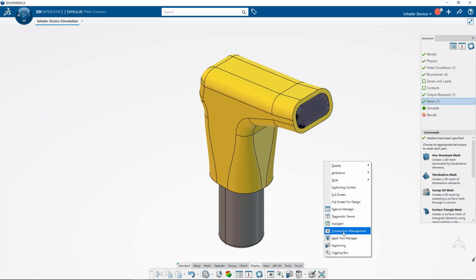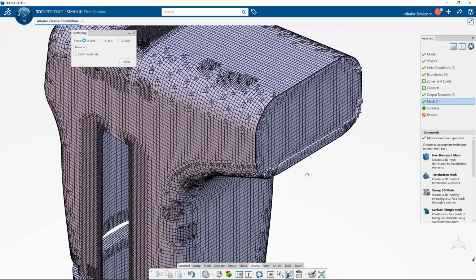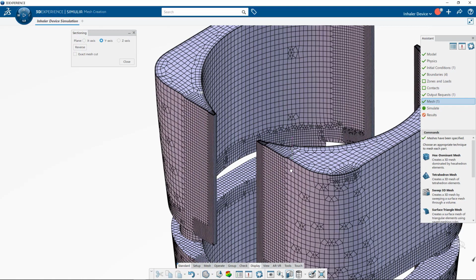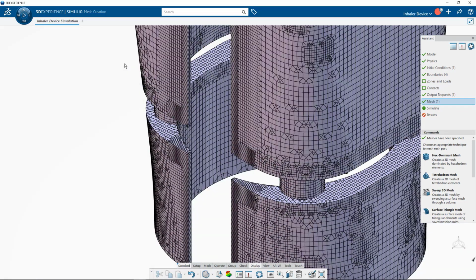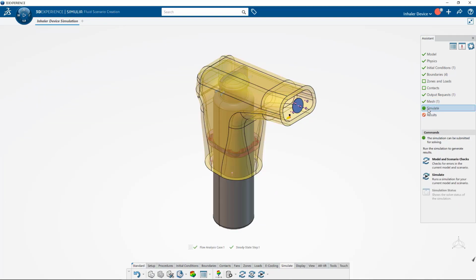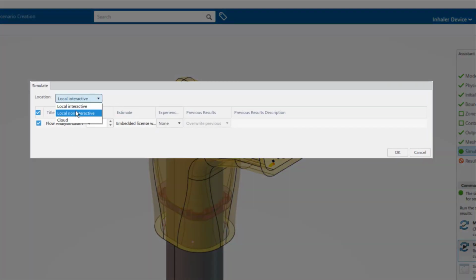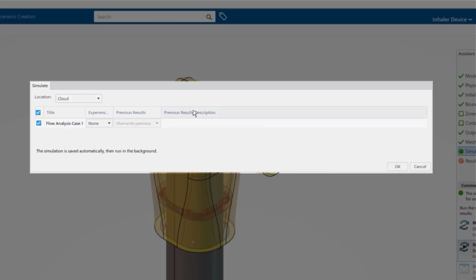The Fluid Dynamics Engineer role significantly reduces turnaround time for simulation model setup, with fully automatic fluid volume extraction and body-fitted meshing, including boundary layers, based on hex-dominant mesh technology. Users can execute flow simulations either locally with up to 16 embedded cores, or by leveraging cloud compute.